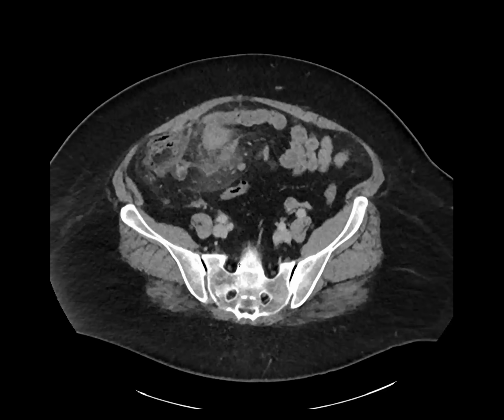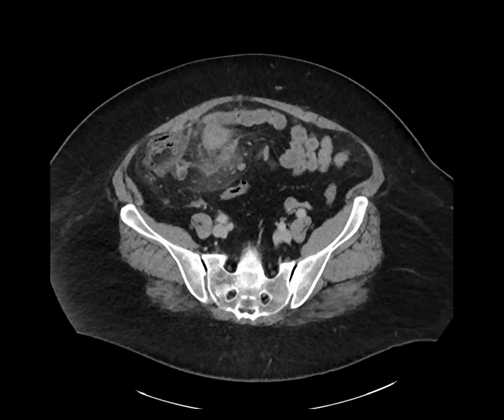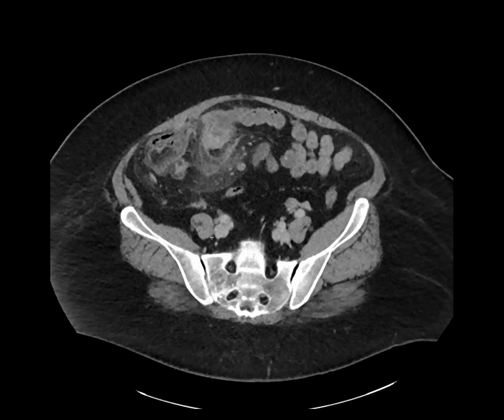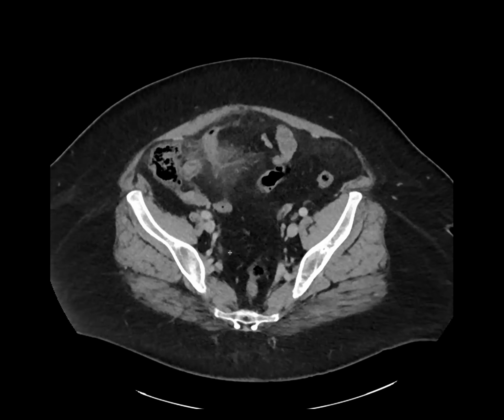Is it perforated Meckel's? And where do you see the Meckel's? What made you say that? We see the right TI, right there. That thick soft tissue, yeah, right there. That thing. Yes, so this was that. It was exactly Meckel's, and you guys are amazing.